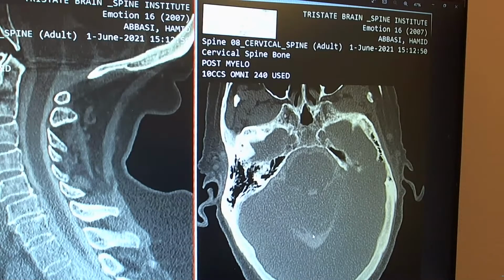So where is the contrast? Can you tell me that, Christina? You can type your answer in. No, I don't see any answer. Here we are. That is one of the sinuses. No, it is not one of the sinuses. Anybody else can answer as well. No, obviously the contrast is not in the blood vessel. The sinuses are blood vessels that bring the contrast back.